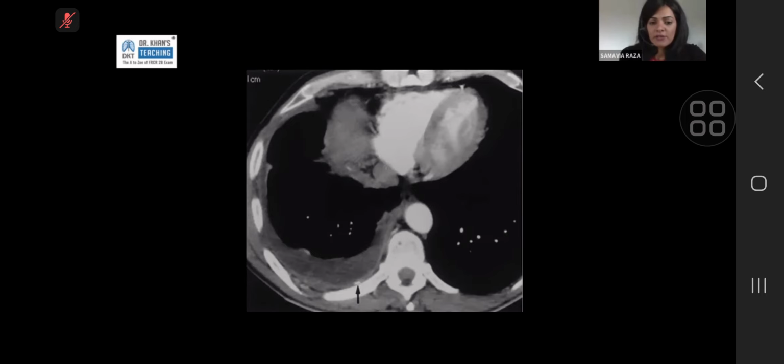So in that context, when you see this pleural thickening next to it, the non-calcified bit, you can see that this is quite thickened. Then it gets thin. This thin rim is reassuring. This thick rim is worrying. Then you see the fat next to it. You are reassured. Then you see the calcification and you start to wonder. So this extrapleural fat is not hypertrophied. When you have infection or when you recover from infection, extrapleural fat hypertrophy suggests on CT and imaging that this is benign. This is not enough to qualify as hypertrophy.